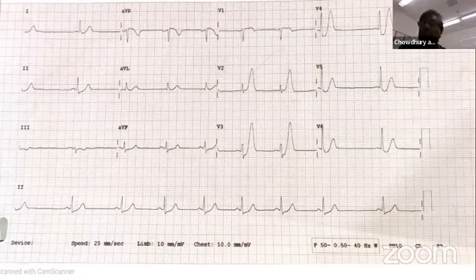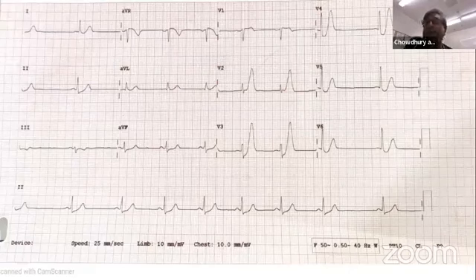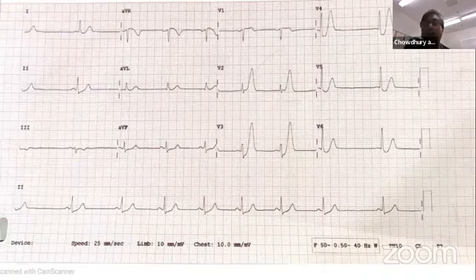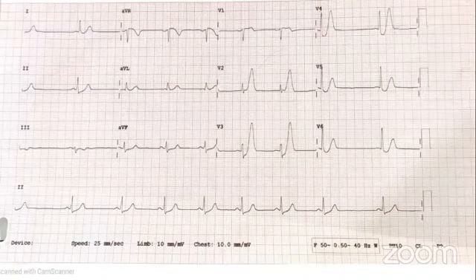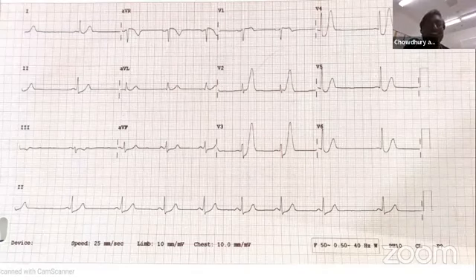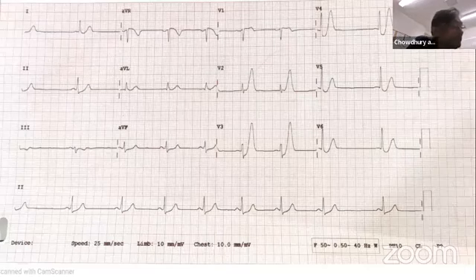If there is an ECG like this and I don't know anything about it, then I will consider a few things: hyperkalemia, maybe hyperacute T, maybe De Winter's. That's the classical LAD thing. So this is beautiful.